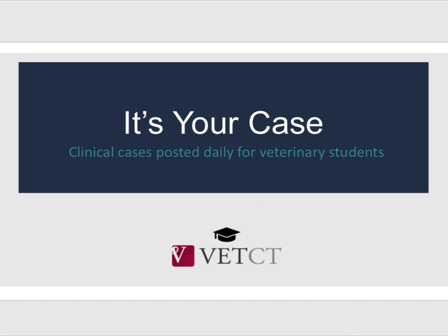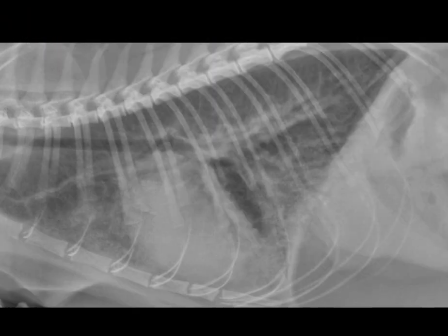Today's example, it's a 3-year-old female spayed domestic short-hair cat who's having dyspnea, lethargy, and inappetance. Now, I'll highlight some of the most important findings for heart and lung in this case.